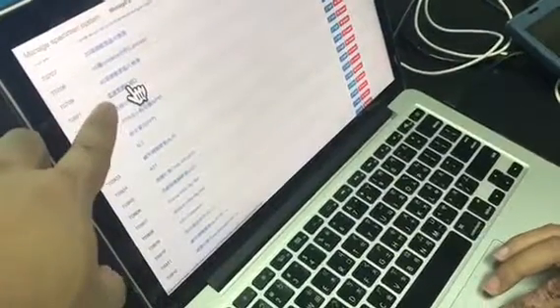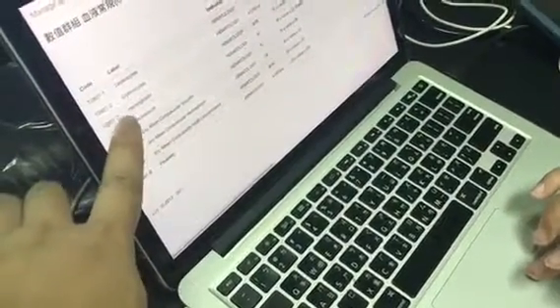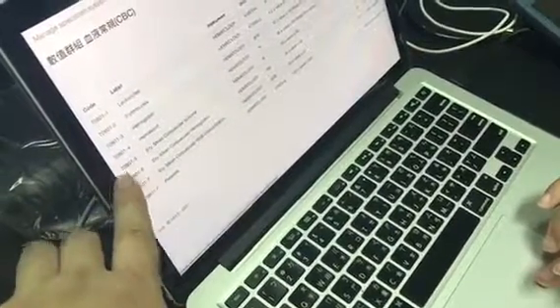Here I want to show you one more thing: you can customize your package for the testing. Just like here we have a CBC test, and in the CBC they have to do several things, and you can define each of them with any type for the end result. Okay, let's just choose one.